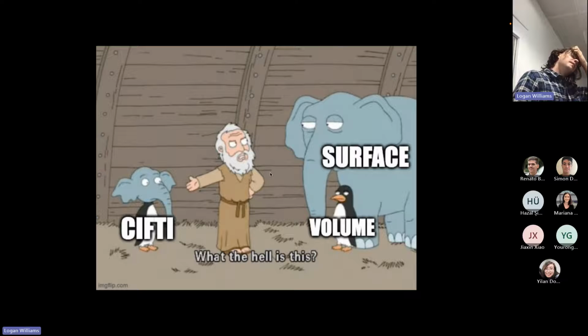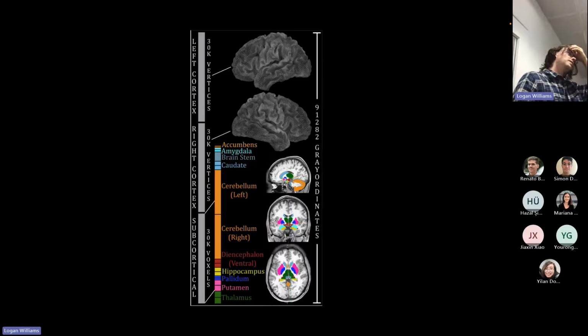The next thing I want to talk about is a cifti file. Basically, a cifti file is a way of representing different components of brain anatomy in the most representative geometry, which is a way of saying that anything that is subcortical should be represented with voxels and therefore a volume, and anything that exists on the cortex should be represented as a surface, and so we use vertices. So a cifti file is a combination of both of those things.